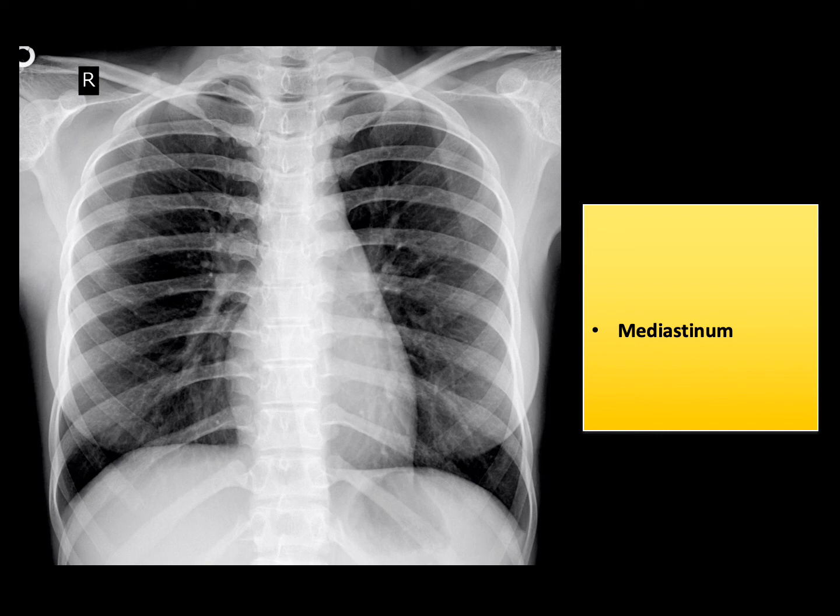If you look at this radiolucent stripe over here, that is the trachea that we see. Okay, the trachea bifurcates into the right bronchus and the left bronchus. So this area is known as the carina.